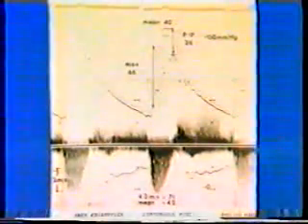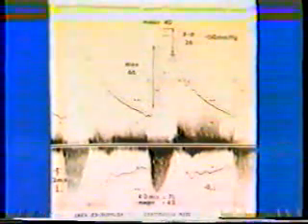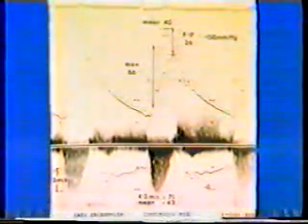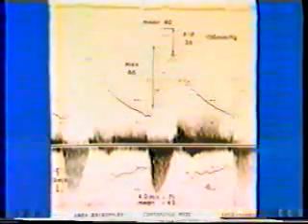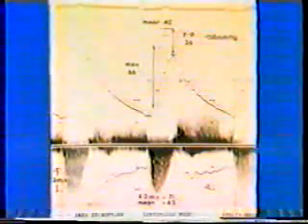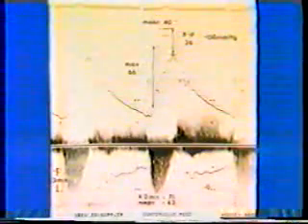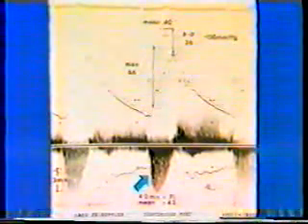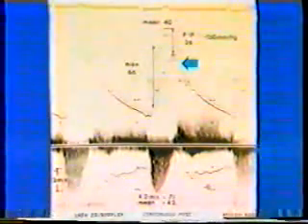On previous tapes in this series, we have demonstrated use of the simplified Bernoulli equation to assess stenosis of native valves. We can apply this same equation to the study of prostheses. In a Mayo Clinic study, Dr. Darrell Burstow performed continuous wave Doppler examinations of prostheses, and the velocity spectra were recorded simultaneously with pressures from invasive catheterization.